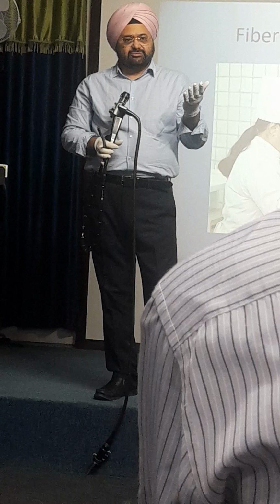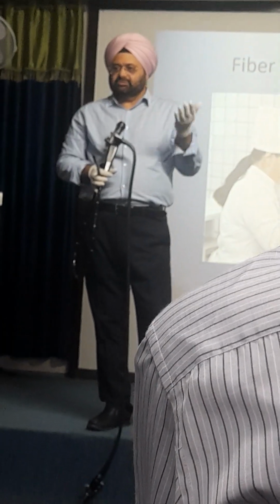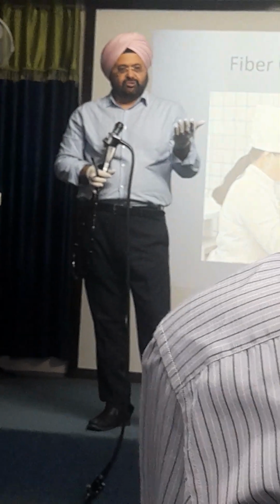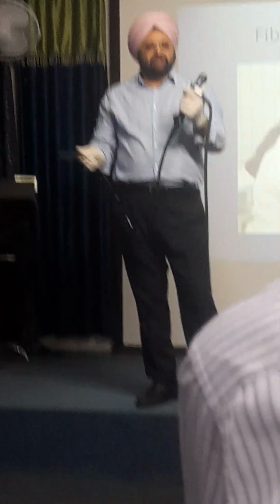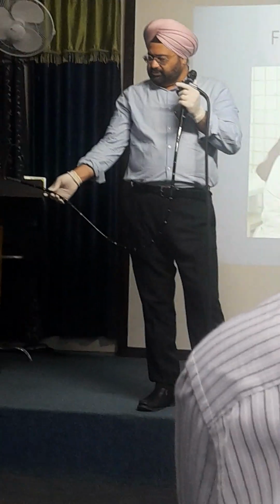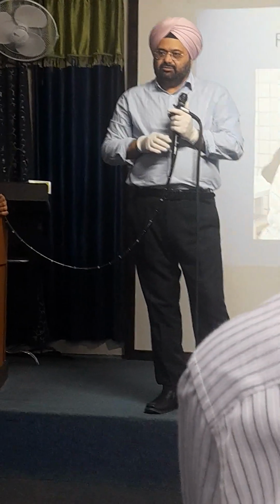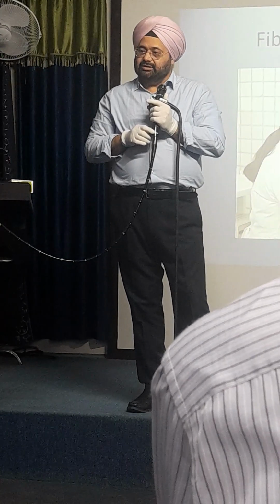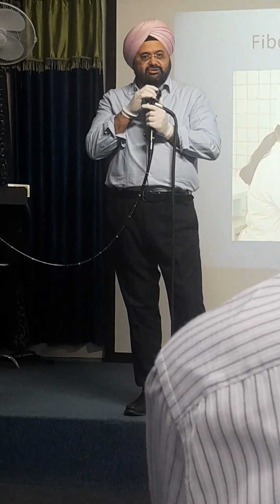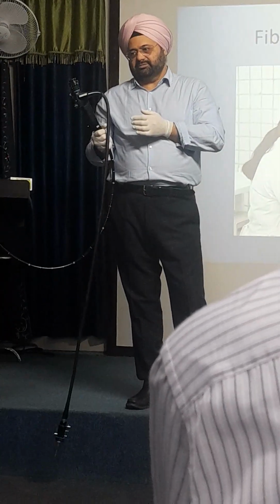There is no camera system. You cannot take photographs, pictures. So in your report, there won't be any pictures, no photographs of the lesion, what you have done. And it is difficult to use this. So from time to time you're doing a procedure and now you want to take an accessory inside. Every time you will have to take your eyes off this, ask for the accessory, put it, and then again go back looking. So these are the older ones.